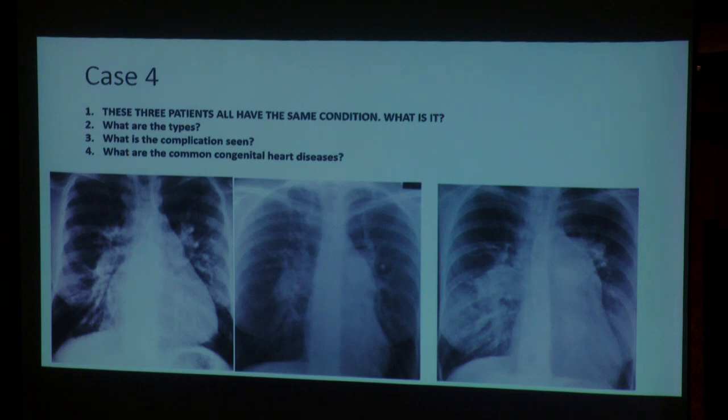Okay, these are three patients, all of whom have the same condition. What is it? Same disease, but three different patients. What is this? Okay. What are the types? Sometimes the questions are the clues. What are the types? What are the complications? What are the most common congenital heart diseases? Sometimes the questions are the clues.